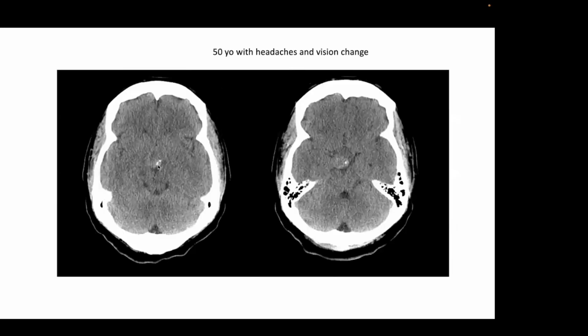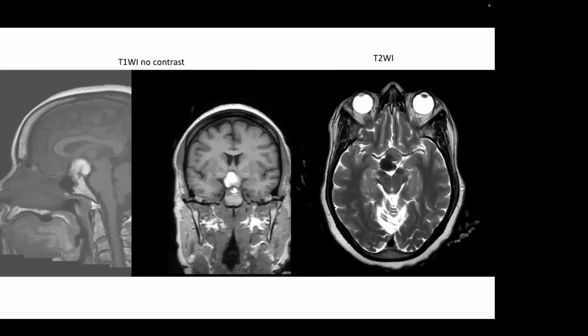If you get caught up in the calcifications, you're going to favor craniopharyngioma, but we know that in adults, craniopharyngiomas frequently don't enhance or don't have calcification. You'll also notice the T1 shortening is fairly diffuse, and it's very unusual that it's completely dark on the T2 weighted scan. Anybody want to offer a diagnosis here? Lymphoma? Aneurysm?